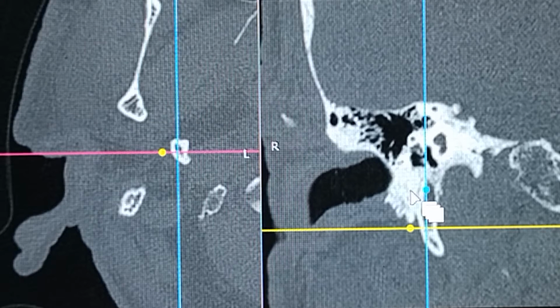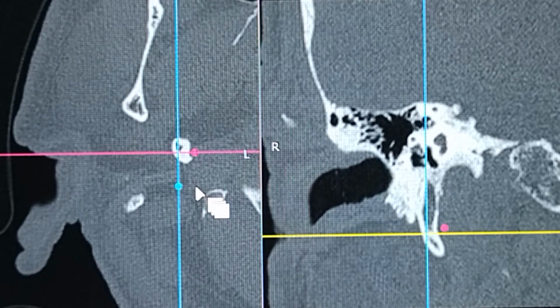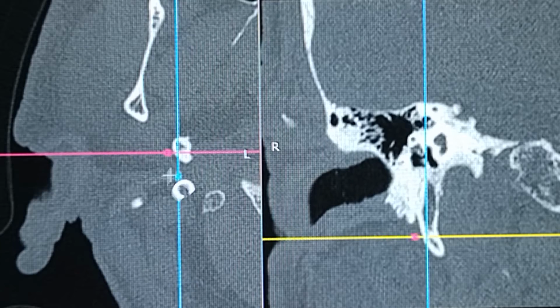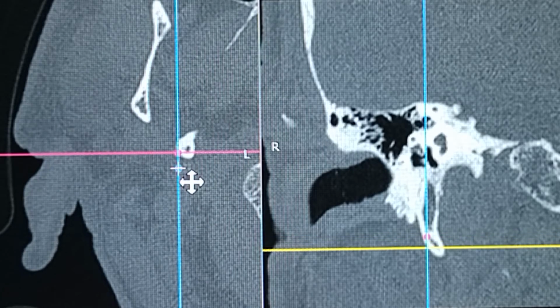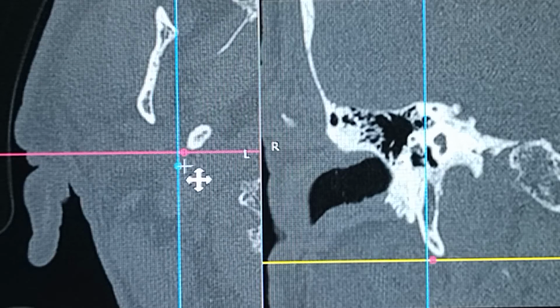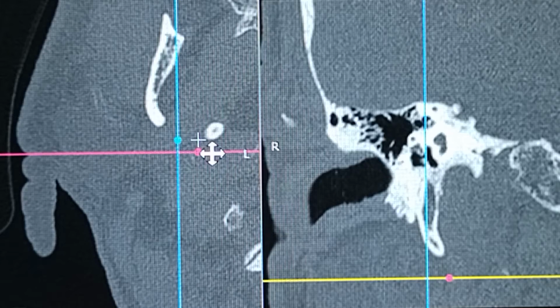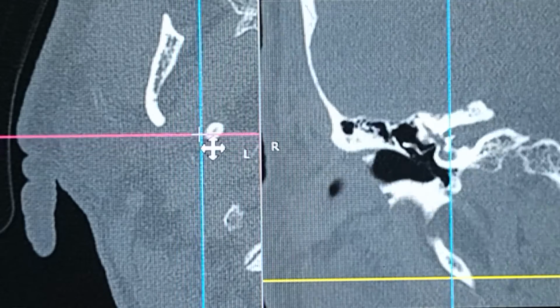So the styloid process is directed anteromedially, that's for sure, and we're going to go more inferior so that the mastoid tip disappears, and still the very tip of the styloid process is quite visible to us. So that's still going below further. You can see the mastoid tip over here. Now I'm going to keep my navigation cursor over here.